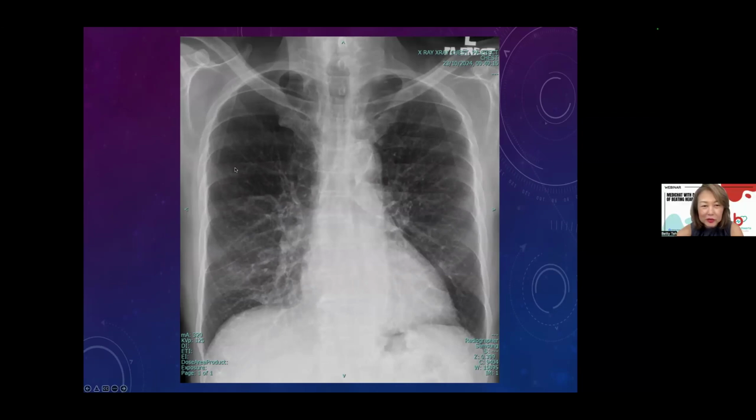Okay, the abnormality is over the right side of the lung. Right side of the lung, there is some more. This one is also a revision for our review area. Come on, guys. Actually, right lung, we will see there's some opacity and reticular changes, right? Yes. All right, here actually at the left lower zone also, these are all fibrotic changes. So I won't show you just fibrosis. Where else in this X-ray?